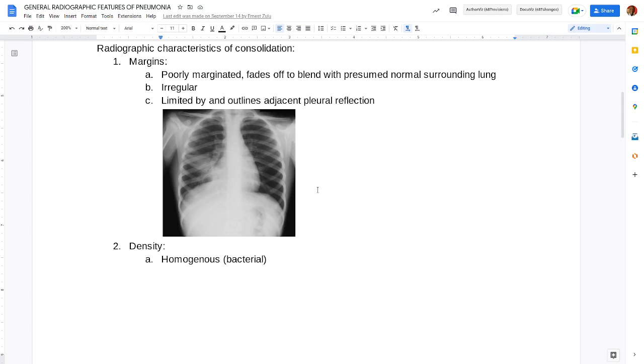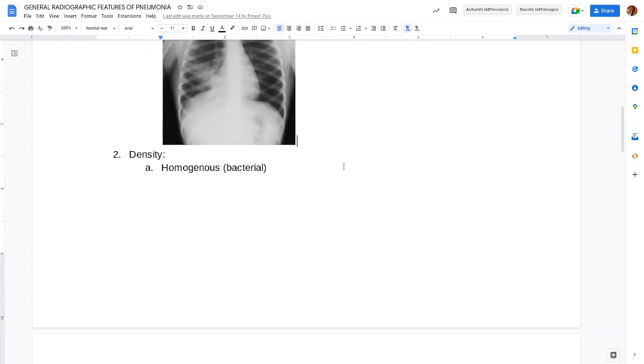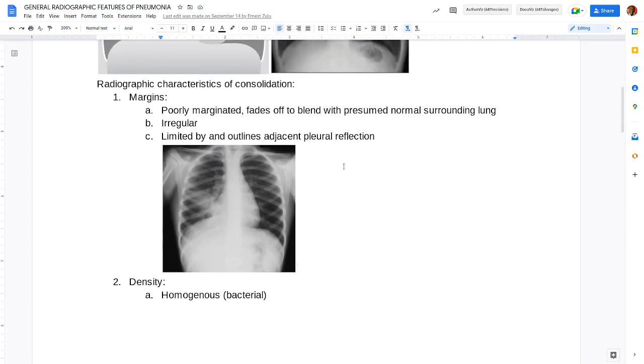So you may find that when you image, if the infection is very close to one of those partition lines, you will see an abrupt end of that white patch, not crossing to the next lobe through that fissure. So I think the best is for me to add more images to demonstrate what I'm saying. Maybe part A should have its own image, part B and things like that. Yeah, I think that would be very helpful.